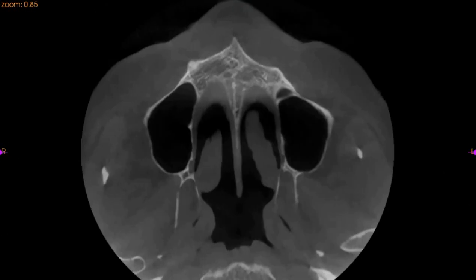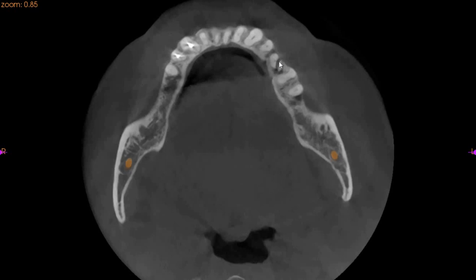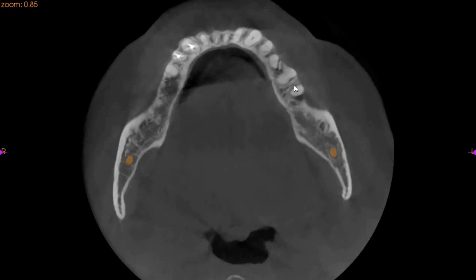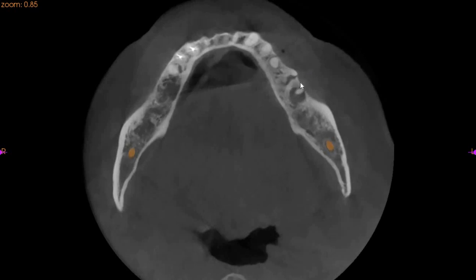This is the axial view. We'll show you the axial view of the lower arch. So we can see that this is the fractured lower left segment, this lower left second premolar. We've got very damaged and atrophied ridge around the premolar radiolucency. This is the mesial root of the lower left 6. This is the distal root. This is the distal pathology.